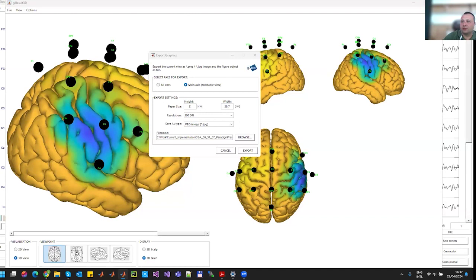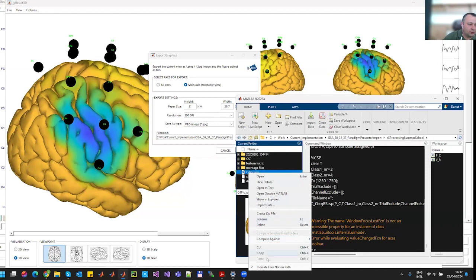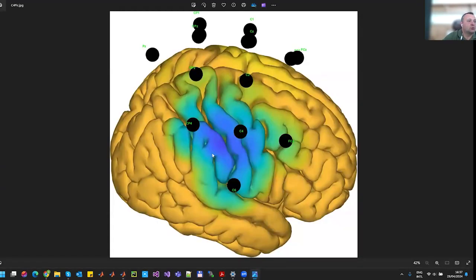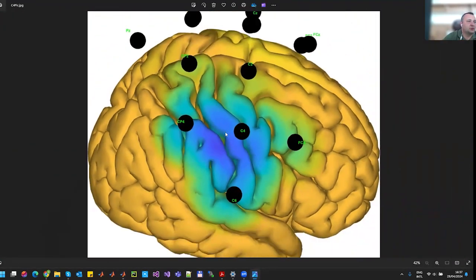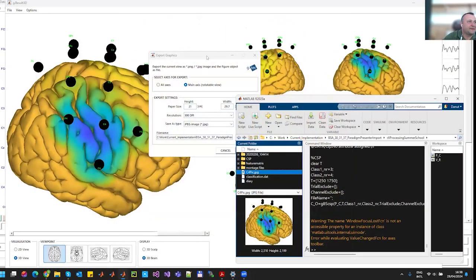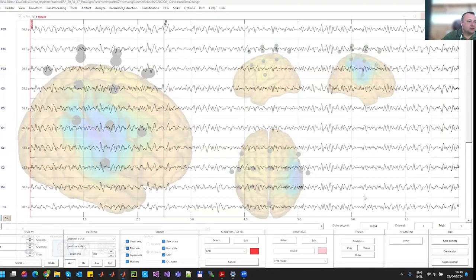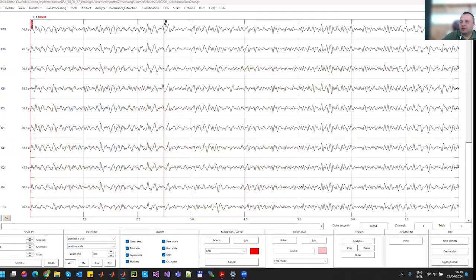Okay, and now the picture is saved in the same working directory on the path that I set. And now I will open it outside MATLAB and we can zoom in and zoom out. To be honest, this is a very nice feature for different journal papers and so on. Okay, so this is the whole process. This was the whole processing chain for a recoveriX dataset.